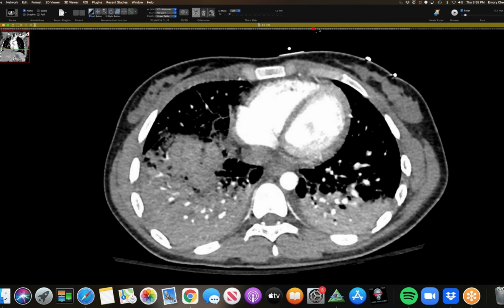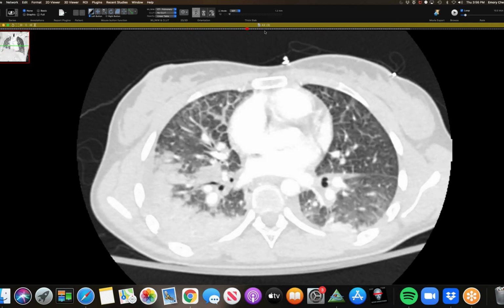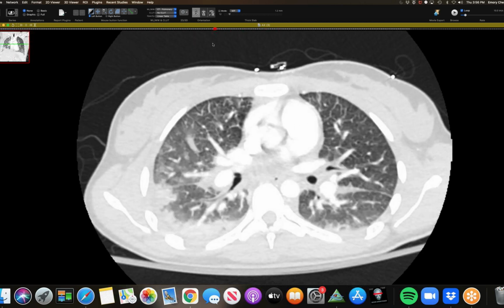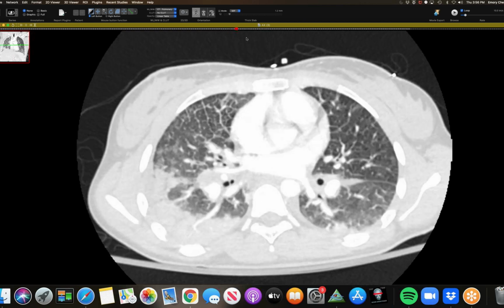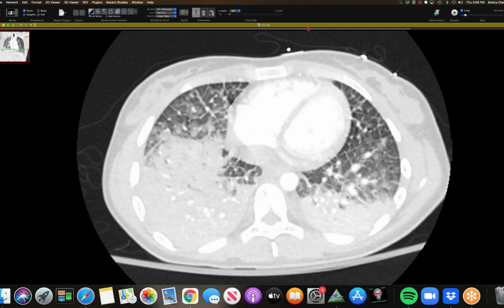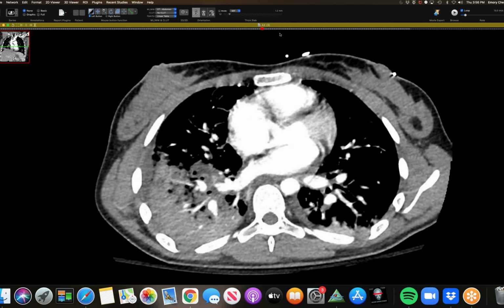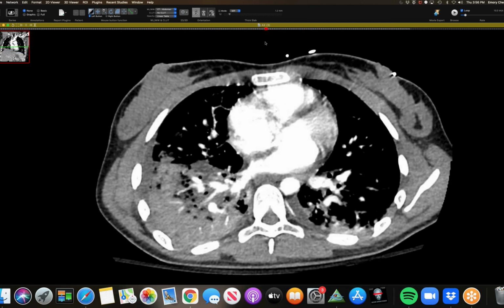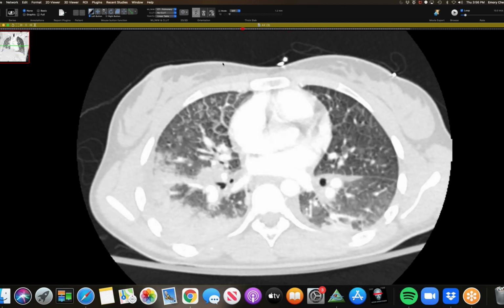That's an example of permeability edema, and it doesn't seem like at this point there's any diffuse alveolar damage here. So you get permeability edema without DAD, which probably comes down the line. I don't know. Hopefully it'll resolve. The nodal pathology is probably edematous nodes. Yeah, that's pretty impressive also.